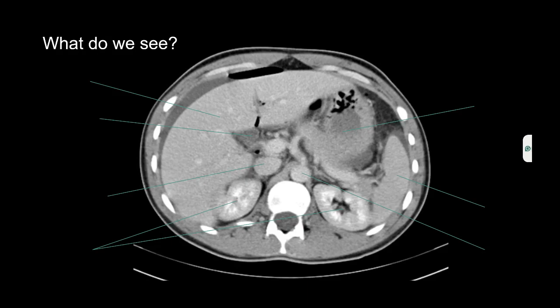All right, so we're just going to highlight some of the key structures that you'll typically find in the CT to help orient ourselves. And as a general reminder, similar to the x-rays, when we're looking at a CT, our right and our left is flipped. So it's as if the patient's feet are pointing directly at us and the head is away from us.